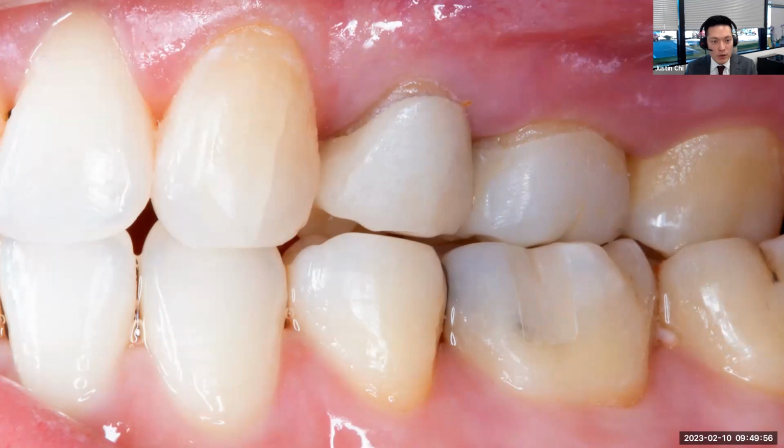All right, the next case that I want to review with you, this is number 12. Could be 12 or 13. Patient had one of the premolars removed for ortho. You can see there is a space. The patient's chief complaint is a gap with her restoration, and you can see there's a gap on the buccal. The original restoration is more edge to edge, but notice as we move more distal, it goes from edge to edge to a crossbite situation.